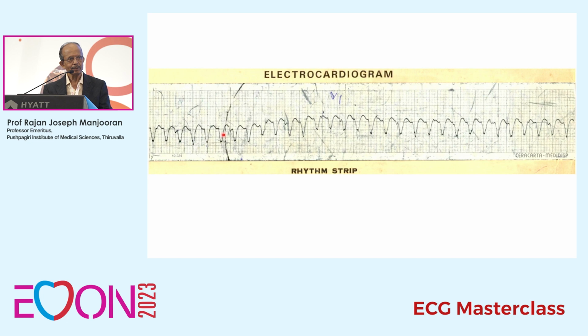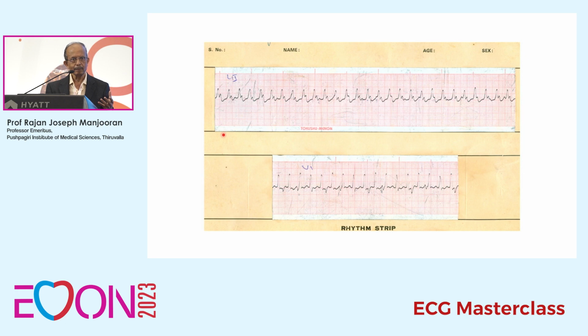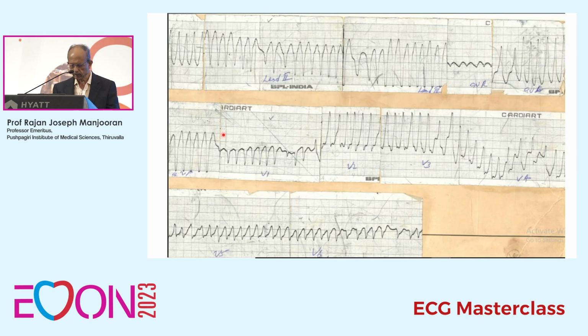Diagnosis. This is a broad QRS complex tachycardia. The default diagnosis of a broad QRS complex tachycardia is ventricular tachycardia. Very good. This is a ventricular tachycardia. I am not spending much time on that. This also is ventricular tachycardia.